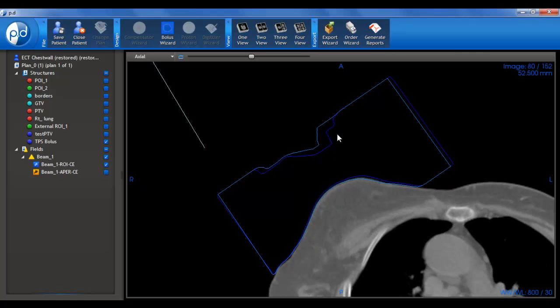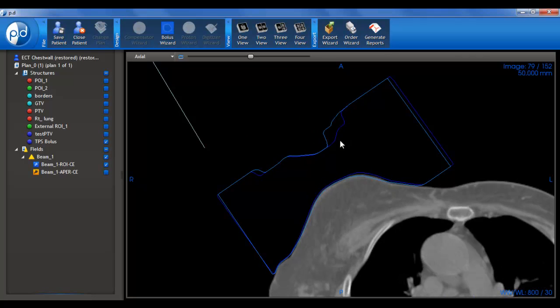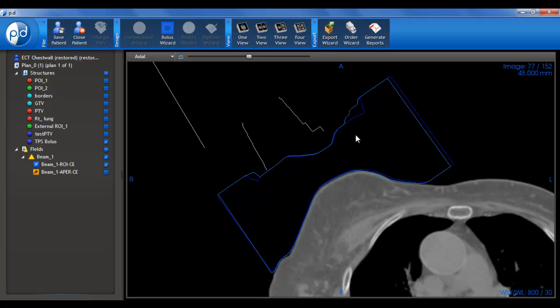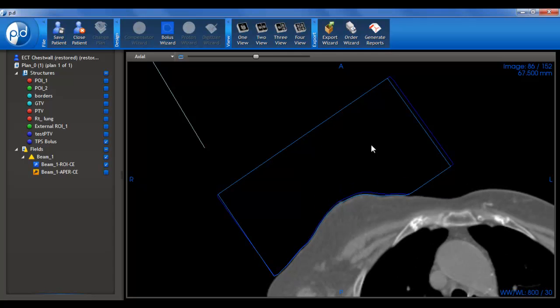Well, when we go through the slices, we can see that the surface is changing position very rapidly in that third direction. Okay, so that's why the rolling ball smoothing appears to be doing a poor job of fitting, but we need to remember this is a 3D algorithm, so when this applies, it's using all three directions when it does this. It's not simply rolling the ball along a contour. It's also using that third direction to pick that value up.